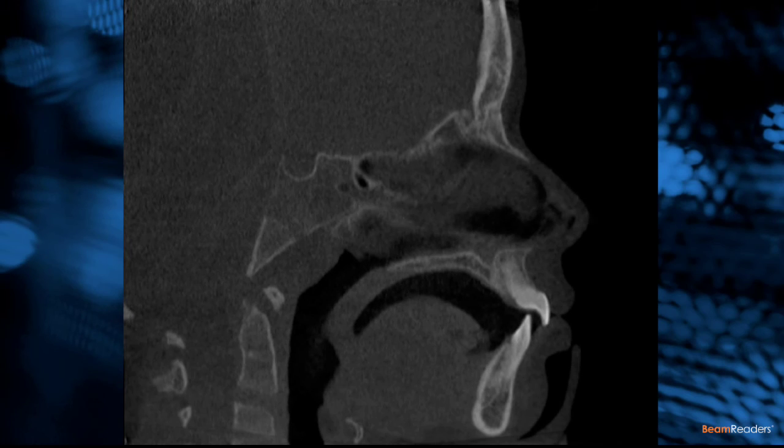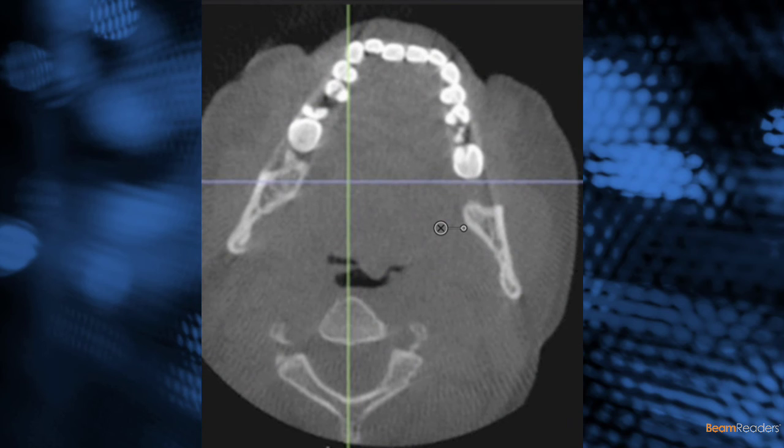Here's a sagittal view of a young child. I think you can appreciate that there is significant space between the anterior aspect of the chin and the chin rest, so don't have an expectation that that's going to impact the occlusion on your patient. But also notice that the tongue is retruded in the scan. The green line here indicates the true AP orientation of the cervical spine.